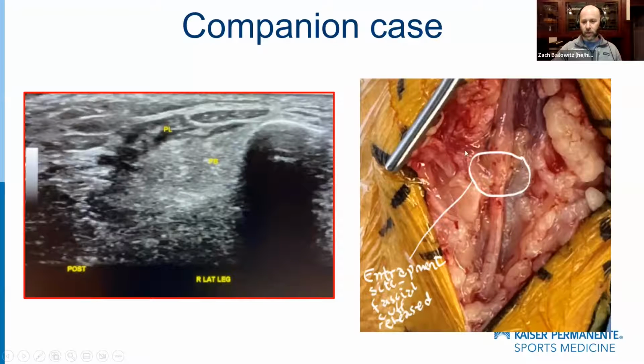And the surgeon was actually kind enough to send me an image of where the entrapment was. And you can see some nerve thickening just proximal to the entrapment site. And you can actually make out distal to the entrapment site, where the nerve starts to look like it's probably dividing into those two branches here, with that little probably epimysium band here right in the middle. So remember that when you're scanning these nerves, also look at what the normal muscle architecture may look like. And that's why I kept pointing out the extensor digitorum brevis earlier on.